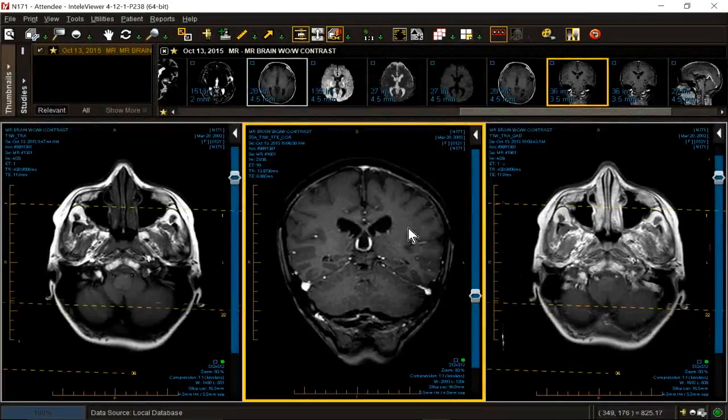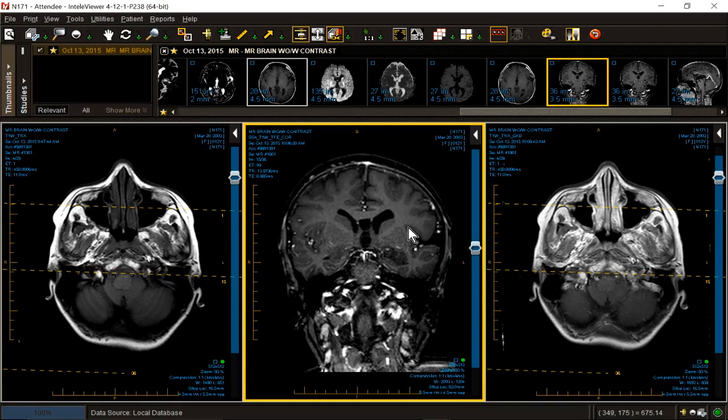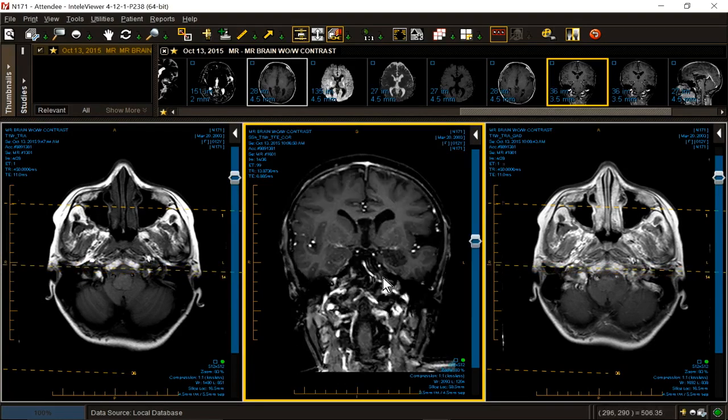Do they get gliomas? They have a slight increased incidence of gliomas, just like they have a slight increased incidence of astrocytomas. So if the patient didn't have NF1, what would our differential diagnosis be? Is it a mass? Yes. Is it intraaxial? Yes. So we have to favor some type of low-grade primary temporal lobe neoplasm.